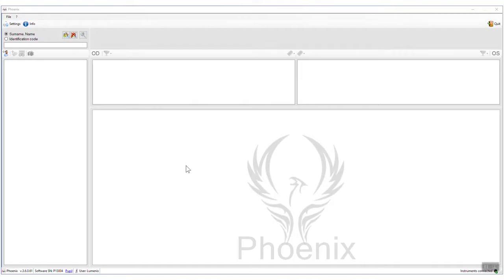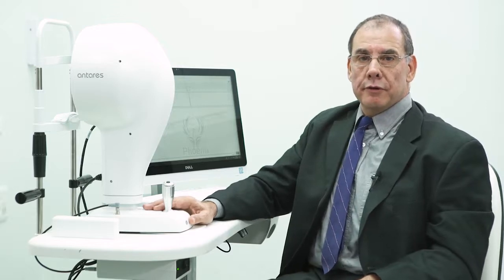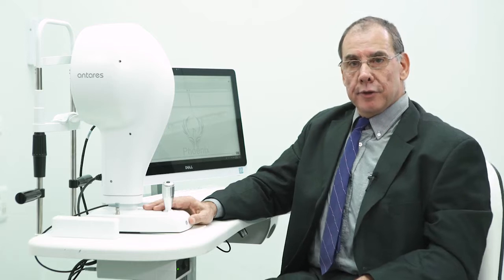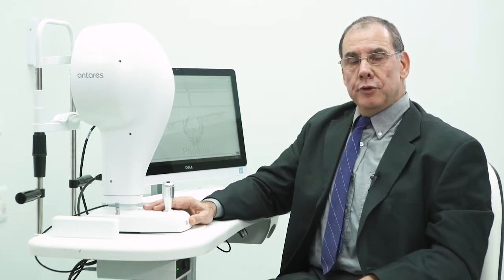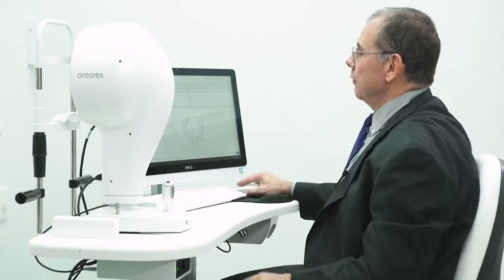What we'll look at first is the Phoenix program, and we'll look at the different options and the various things that we can do with the program, and the interconnectivity that we can have with this program, and how it can be utilized within your offices. So without any more delay, let's get started straight into the program.